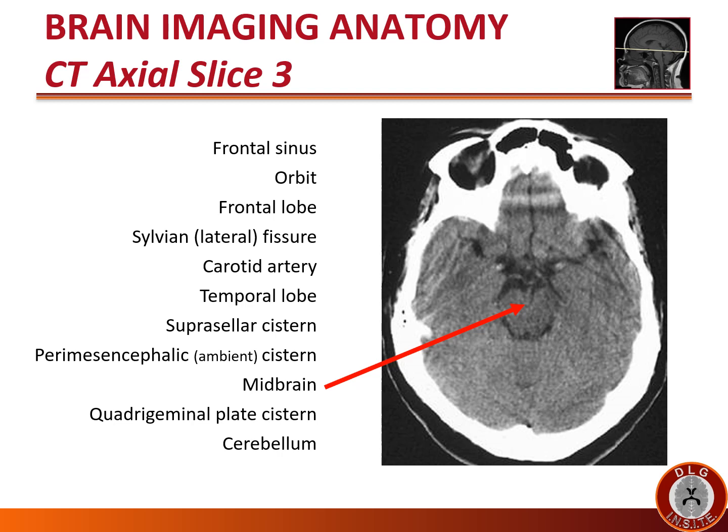We are now at the midbrain level of the brainstem. The midbrain is recognizable by the two smaller lumps dorsally or posteriorly called the colliculi, and more anteriorly or ventrally the larger rounded lumps, as it were, that form the cerebral peduncles.